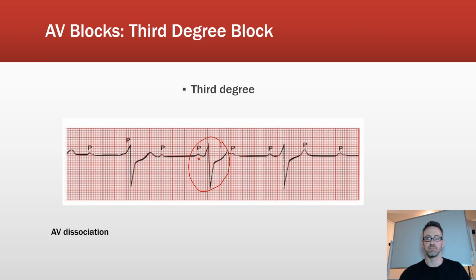It looks pretty wide, okay? But this wide QRS should tell you something first off. The wide QRS means it's probably not being initiated in the normal electrical conduction pathway. And there's usually a regular marching rhythm to the ventricle. In fact, if we were to keep following it, we'd probably continue to see a regular ventricular beat, which would be fairly slow, actually, because the ventricles, if left to beat on their own and keep the pace, are generally slower than the SA node.